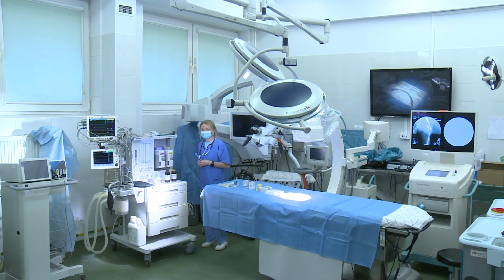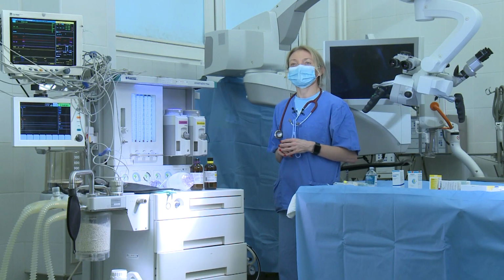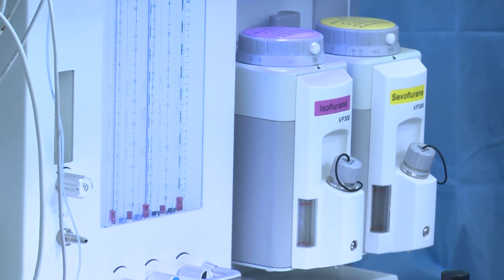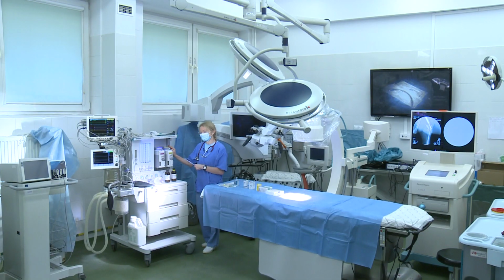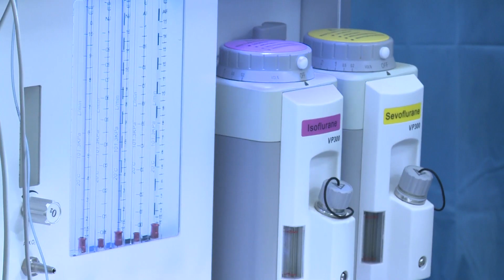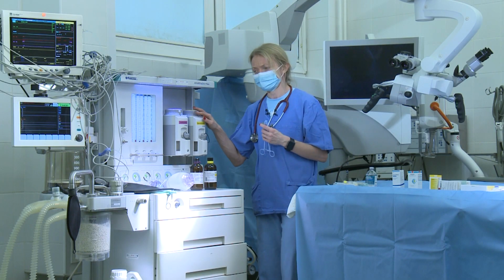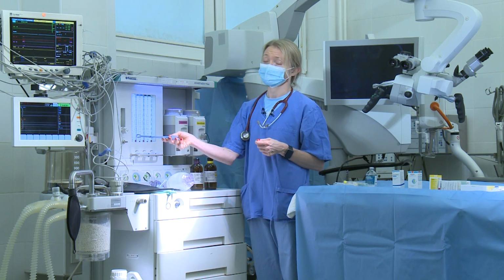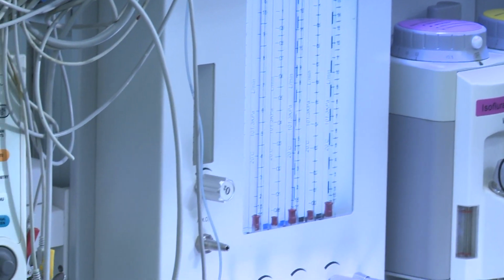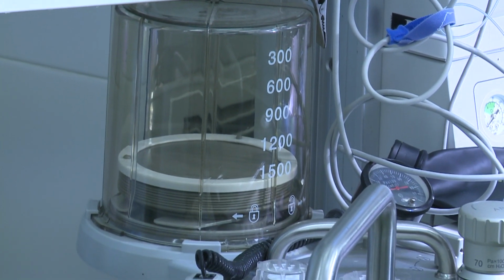At the beginning, I would like you to remember that it's not only a machine which allows us general anesthesia, it's also a life-saving machine. Why? Because not only is general anesthesia possible with that machine, but also artificial ventilation of our patients, which they need in life-threatening situations. Apart from general anesthesia, we are able to artificially ventilate our patients and give them pure oxygen if it's needed in a life-threatening situation during CPR procedures.